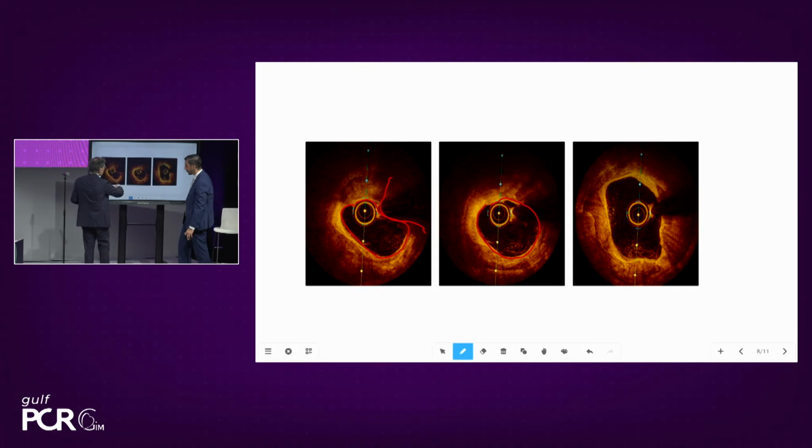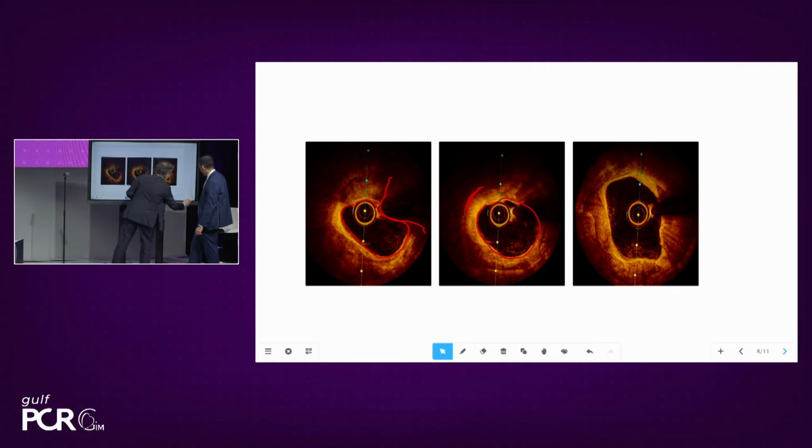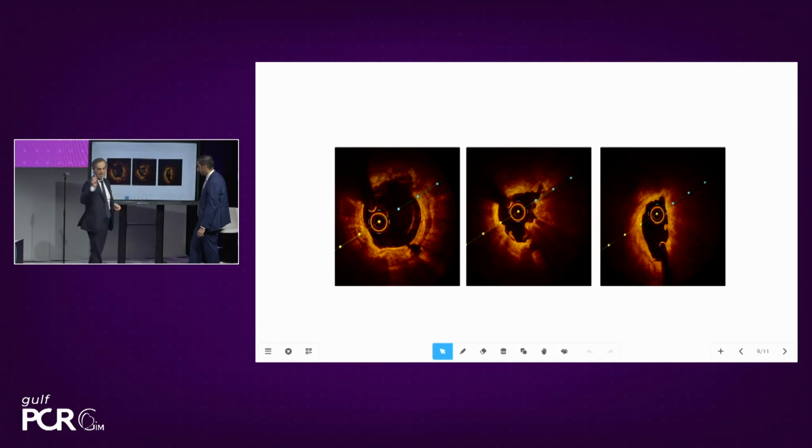So here you can see the calcium. It gives me some idea. We can perhaps recognize a little bit of a segment of the EEL at this point, but the AI cannot work to detect the EEL, because that is an additional feature. In this case, the calcium is destroying the EEL, and you cannot get this. So you are going to be based upon the lumen. So let's go to the next one. And that is the essence.